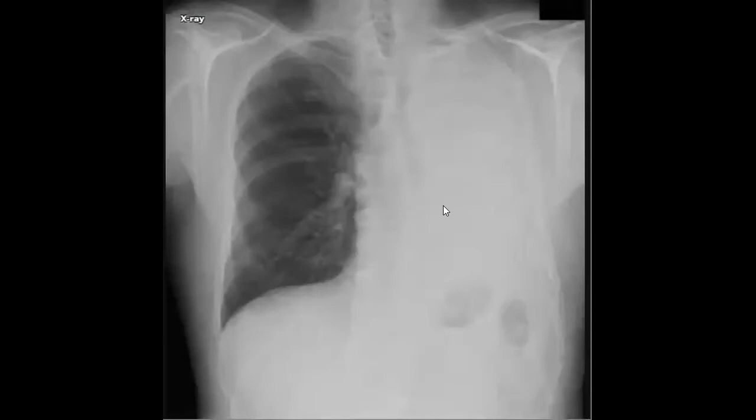This patient did an operation and they removed this. Yeah, he did a pneumonectomy, and you can see that there is some tracheal deviation here, ipsilateral deviation, and pleural effusion. And there is some exam question about what is called bronchopleural fistula.